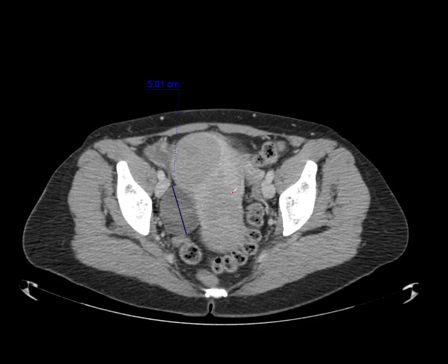Here's a patient who is being followed up for colorectal cancer. This is a large fibroid in the uterus. They were shown to have a cyst in the right ovary, which is 5 centimeters. And perhaps you can see there's a very small area of complexity here, just some sort of faint wisp of enhancement, possibly, but it's difficult to say. So an ultrasound was requested.